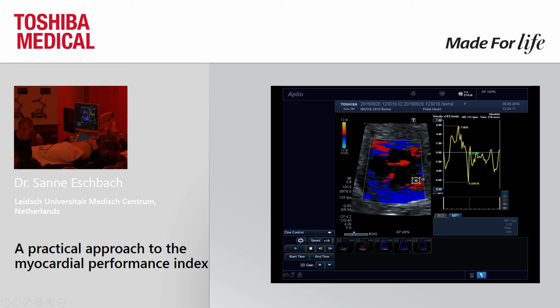We stick not to valve opening and closure, because that is a pulse wave Doppler approach. In tissue Doppler we focus on the very interesting and marked peaks that tell the start and change of the contraction and relaxation periods. So we use the myocardial velocities as an indicator in tissue Doppler. That's where tissue Doppler is good, and taking that advantage, you get highly reproducible results. So that's the take-home message from this approach.